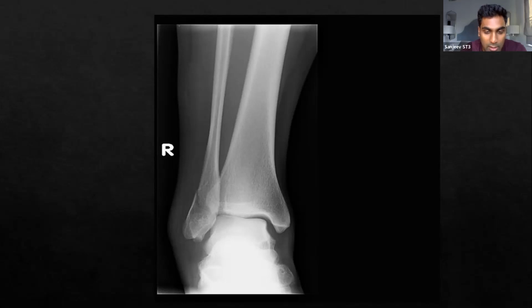So you're absolutely right. It's a distal fibular fracture. I don't know if you mentioned, Sarah, did you mention Weber? No, I just said it's at the syndesmosis. It would be a B, right? Yes, that's right. So this is where a Weber classification may come in handy. But to be honest, even in the OSCE, if you don't remember it, you're not going to get penalized. It might just help you sum up the radiograph a bit more succinctly, but it's really not going to come up in the mark scheme or anything like that.